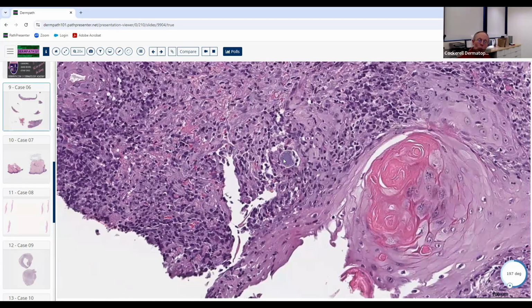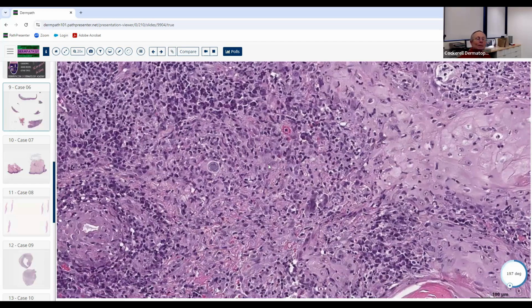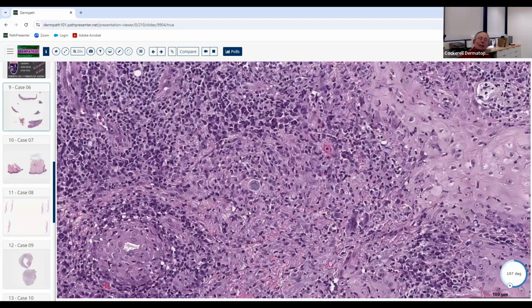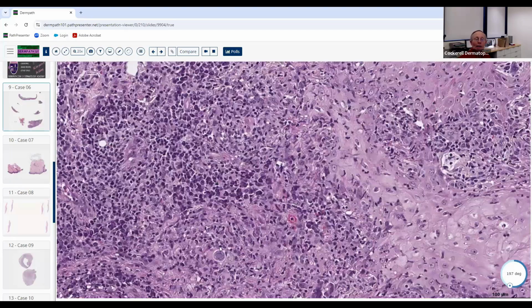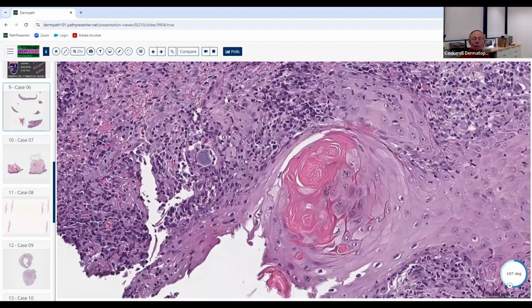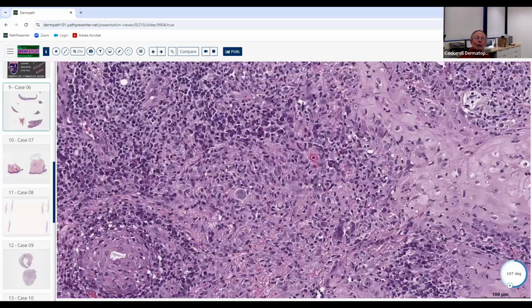So you need to go back and look at one of those in the textbook, then look at this and say, I see, they don't really look the same. They're just trying to trick me. So don't get fooled. Now they might put some other stuff in there too, like tuberculosis or Hansen's or atypical mycobacteria. So just make sure you're looking. The best place to find the organisms, if you see an abscess and you're going to look quickly, is to look for that.